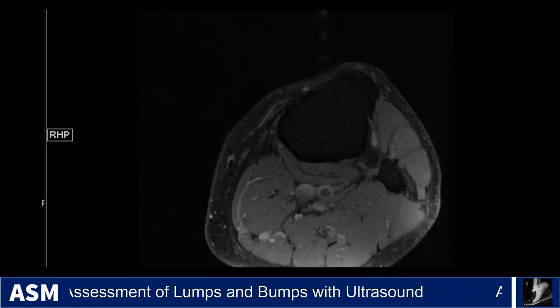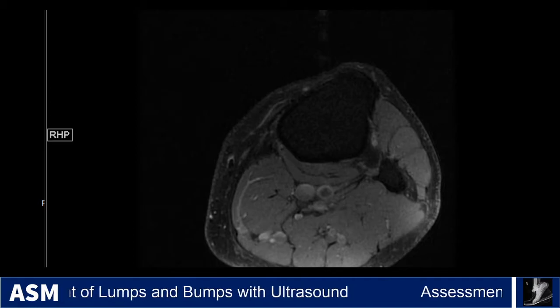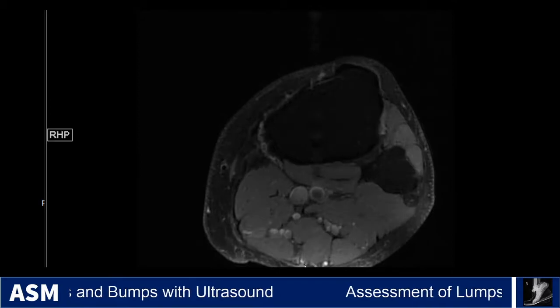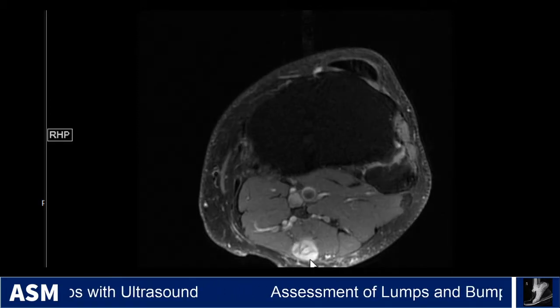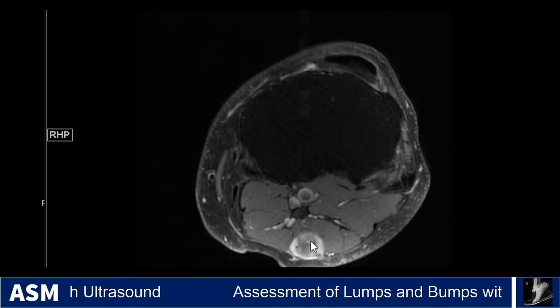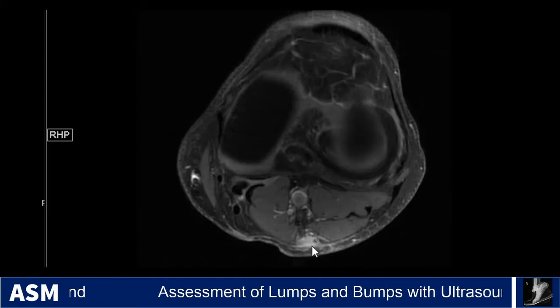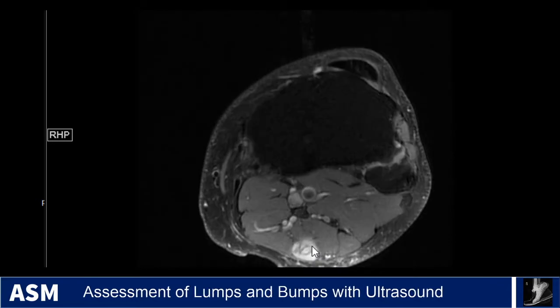On this T1 fat-suppressed post-contrast series, we again see this vein deep to the fascia, and as we come proximal, the vein dilates and starts to fill with this enhancing material, and then it runs again directly into this mass. We see this solid mass with areas of avid enhancement and some areas that enhance a little bit less. So this was, again, interpreted as concerning for a sarcoma.